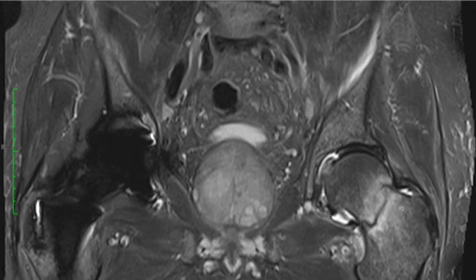Fractures of the femoral neck, actually fractures of the proximal femur, can be subdivided into femoral neck fractures, intertrochanteric fractures, and subtrochanteric fractures. Femoral neck fractures can be further subdivided into subcapital, which is what we've already seen, transcervical, so throughout the mid portion of the femoral neck, and basicervical, which is along the very base of the femoral neck adjacent to the trochanteric region.